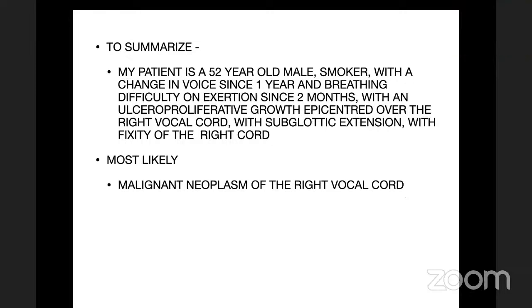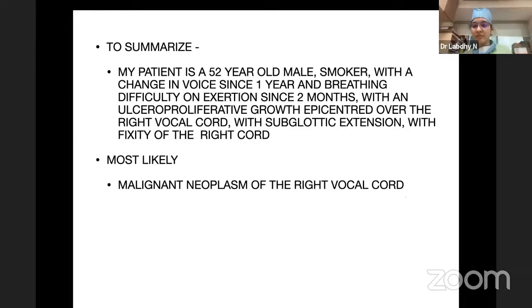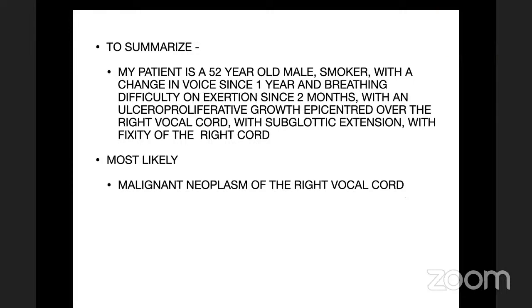I don't think this tumor will go to the base of the tongue. Yes, sir. We look at whether there is pre-epiglottic space involvement, invasion of the cartilage, extralaryngeal spread, and subglottic invasion.